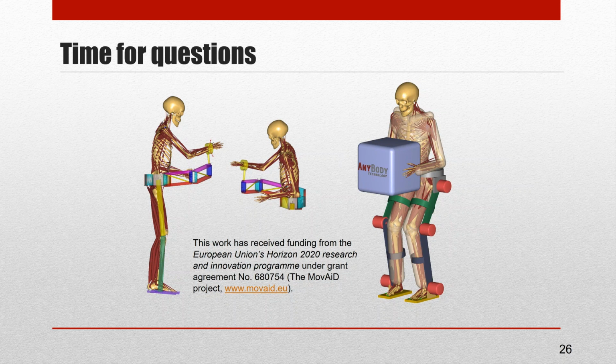But I sense that the question being asked is actually about the keyframe definition of motions, or possibly the one where we use the kinematic constraints to define the motions. Well, if we're talking about keyframe motions, then the way you go about that is that you typically take one of the existing models in the library, the one that's called the standing model, for instance, where you can control the posture through the anatomical angles. There's a place where you can specify what the anatomical angles are. And so by trial and error, you would specify the anatomical angles that correspond to your keyframe postures. It takes a little bit of experimentation, but it's not very difficult.